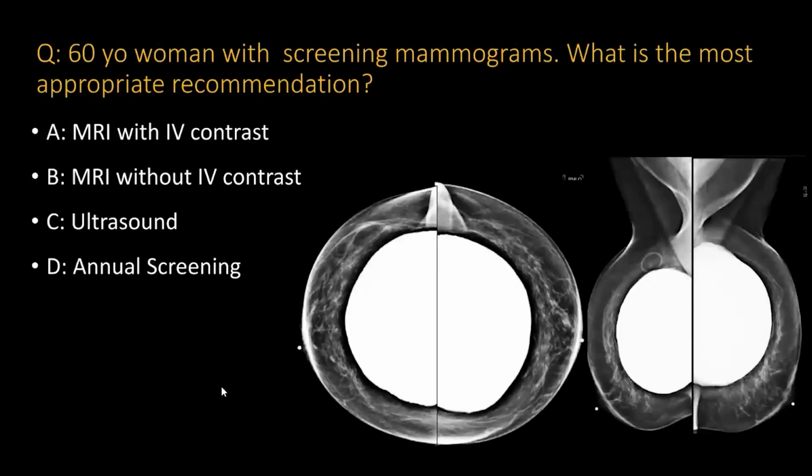Okay, case number 3. A 60-year-old woman with screening mammogram. What's the most appropriate recommendation? This one is pretty subtle. The correct answer is MRI without contrast.